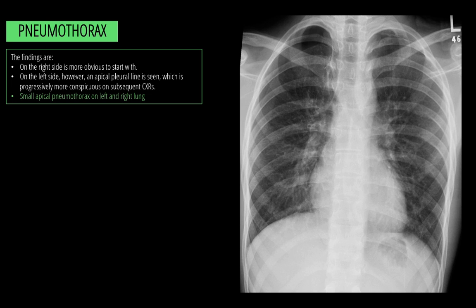So just sticking with the theme of pneumothorax, remember that pneumothorax is defined as the presence of gas or air within a pleural space. When this collection of gas is constantly enlarging with resulting compression of the mediastinal structures, it can be life-threatening, and it is known as tension pneumothorax. In this specific example, in our assessment of the apical segments of both the left and right lungs, we have this region superiorly which is going to be hypodense in comparison to the remainder of the lung parenchyma.